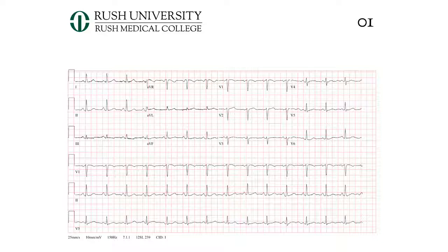Welcome to this video series on how to read an EKG. EKG stands for electrocardiogram. The K is because it's German. Other people call it an ECG. And we're going to step through a process that will help you decipher these waveforms here.